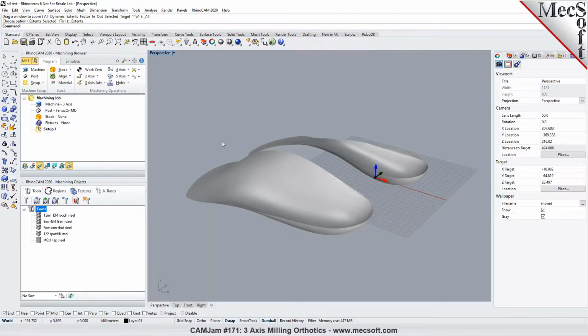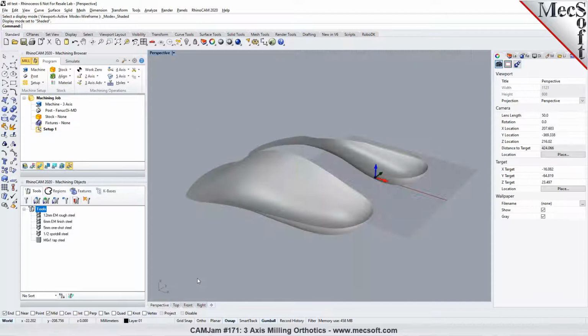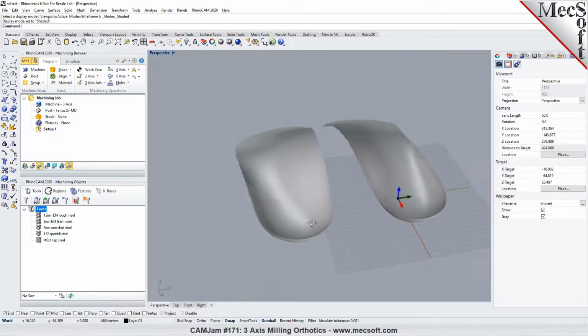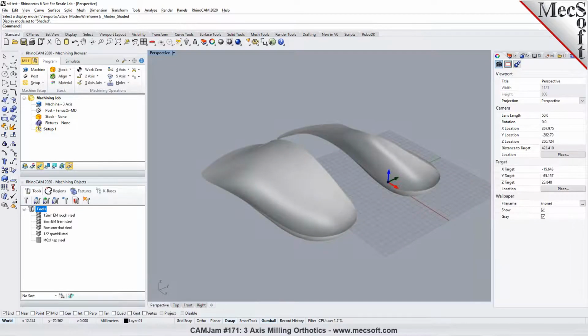Now, so you're going to be looking at creating the mold cavity from this part. Is that correct? Well, ideally we would take a scan of the foot, and the file that would open would be a file of a foot, not the file of an orthotic. Okay. But can we mill out a positive mold off this orthotic? You will have to create one. We wouldn't be able to. You have to do that in Rhino.